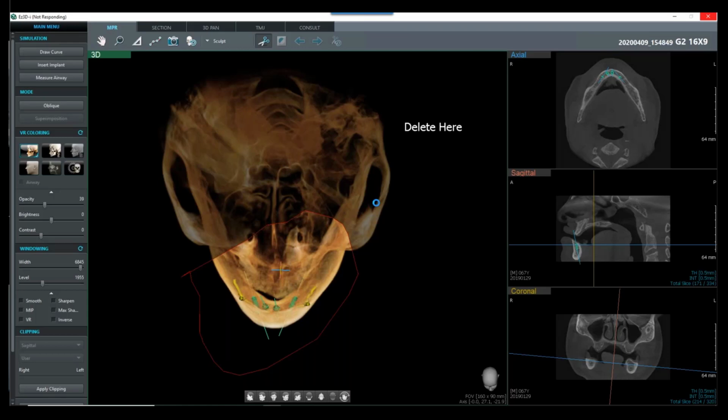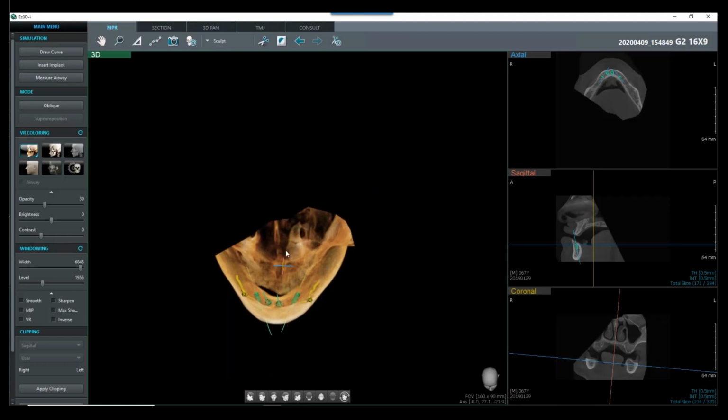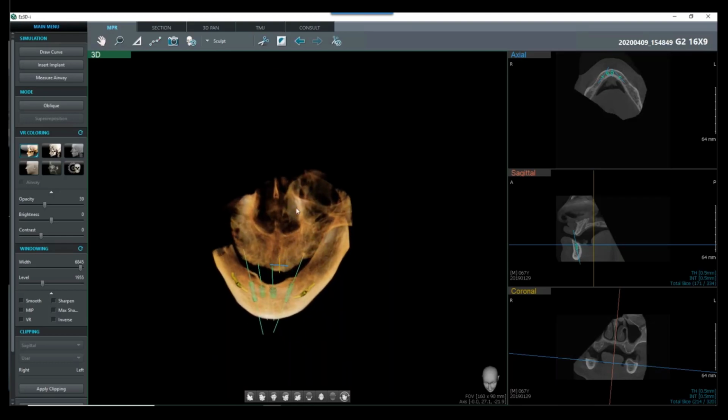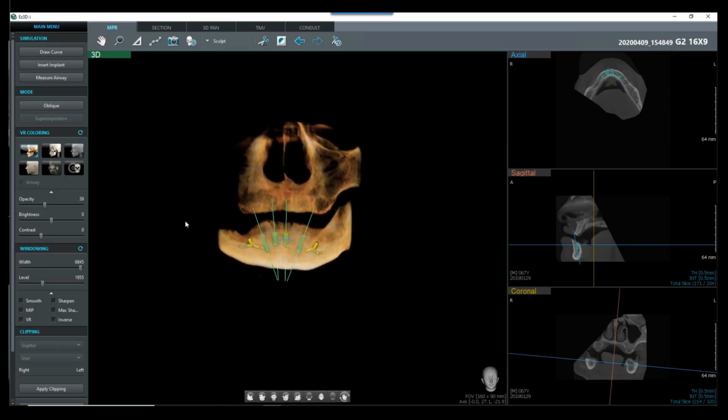So big case, we did not really look at case planning the maxilla. Looks like we're going to be using this for maybe one of our next webinars, so we can look more at that from a clinician's view of case planning and talking to the patient. But there is our scan. We could talk to the patient.